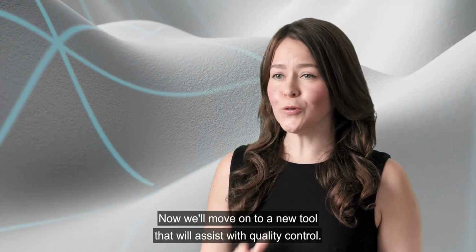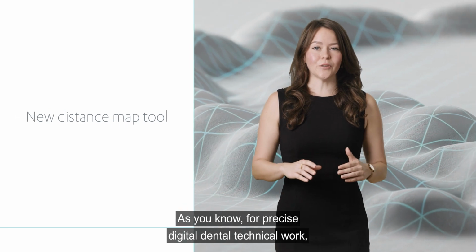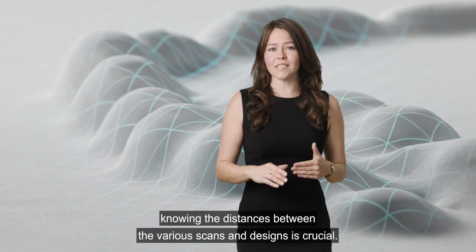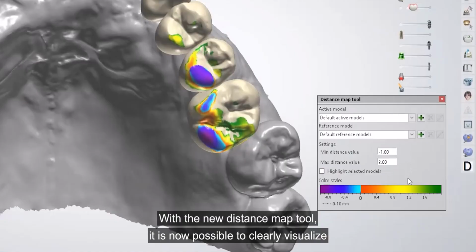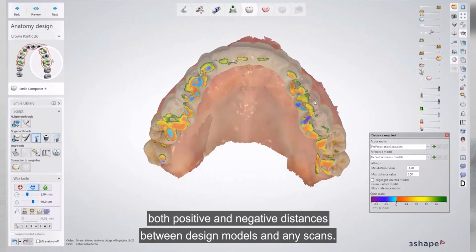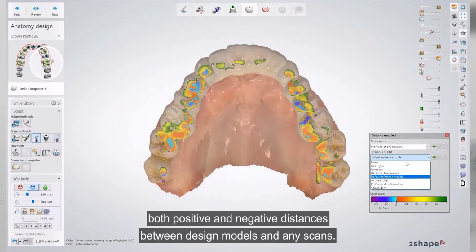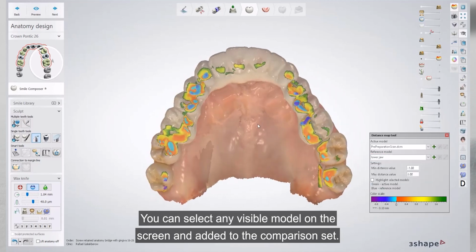Now we'll move on to a new tool that will assist with quality control. As you know, for precise digital dental technical work, knowing the distances between the various scans and designs is crucial. With the new distance map tool, it is now possible to clearly visualize both positive and negative distances between design models and any scans. You can select any visible model on the screen and add it to the comparison set.